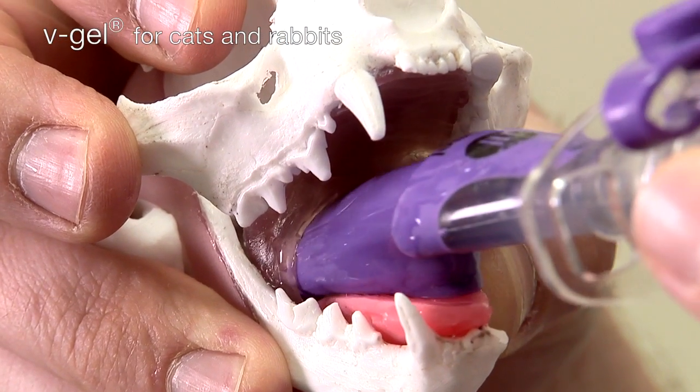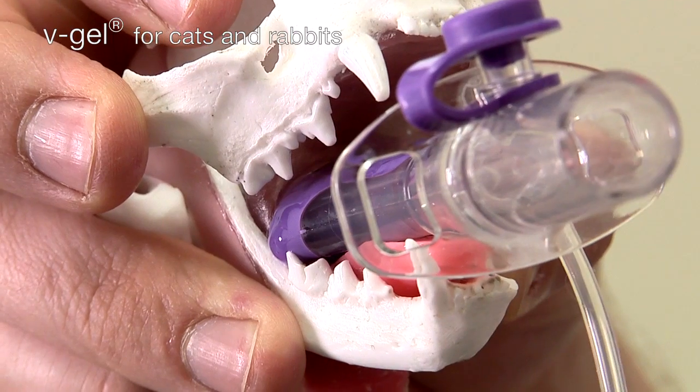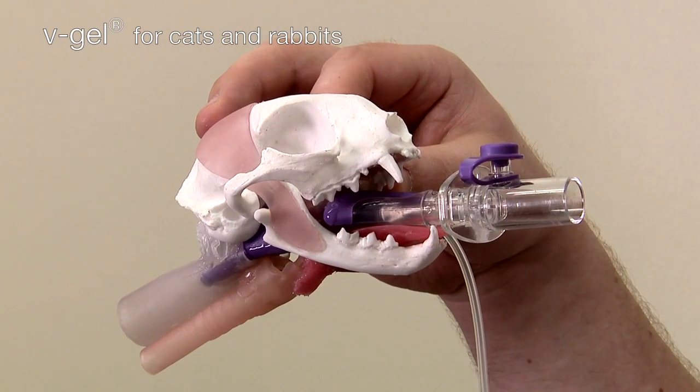Using a v-gel device makes it impossible to damage the trachea and eliminates one more risk from veterinary anaesthesia.